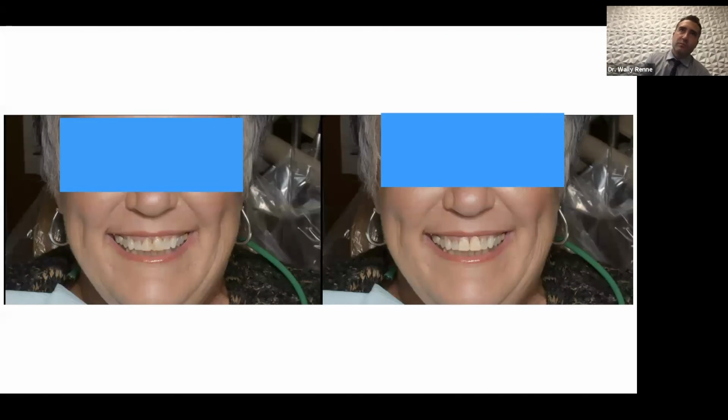So when do you do Smile Design, besides the odd single unit where you look at it and you're like, something's not right, the size just doesn't feel right? And you might say, well, just pick up a probe and measure. You know how many times I've measured wrong and not really understood what I needed to do by measuring with the probe? It doesn't give you the visualization that you need. In addition, it's hard to explain to the patient, who can't see the probe, that there might be a size discrepancy. So you might need to do 2 veneers versus 1, or you might need to do a resin and a veneer. And so, I break out the software often.